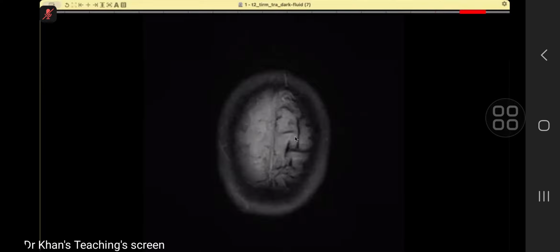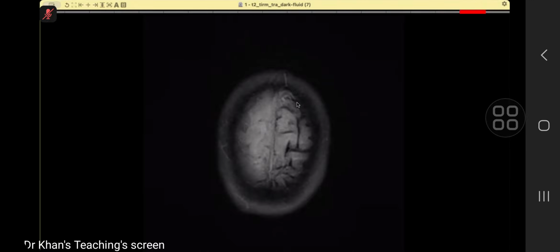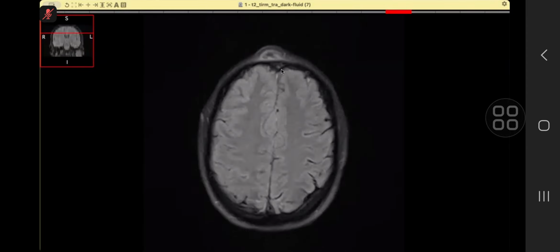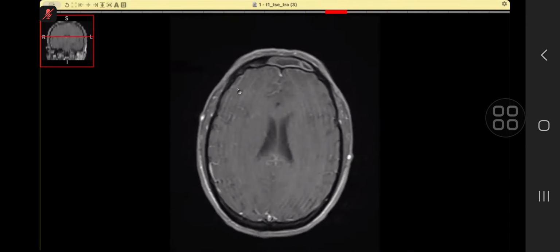Now, if you look carefully, and this is a classical exam case. So this is a beautiful finding, which the examiner will spend all the time on this FLAIR sequence with you. Compare these sulci with these sulci, and you will see how it is attenuated, meaning something is happening there. Then you see this high signal, and then you see some high signal here in the frontal region. And then you have already picked up that there is sinusitis, and of course, there is something happening in the bone. So, sorry, in the frontal region, as in the skull.